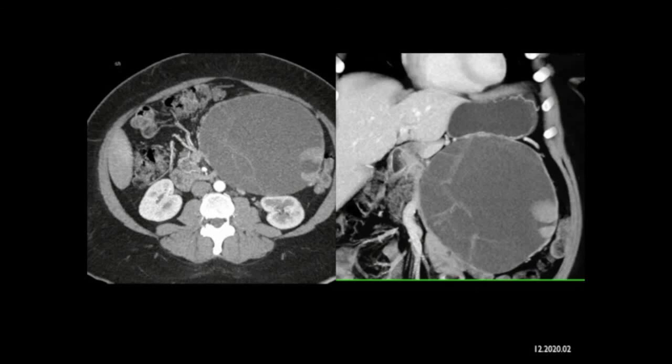I put down adrenal carcinoma. Adrenal carcinomas can be cystic, but not this cystic. Usually they're solid. And GIST tumors become cystic when they're treated, but not this cystic. And serous cystadenoma is indeed a good possibility.